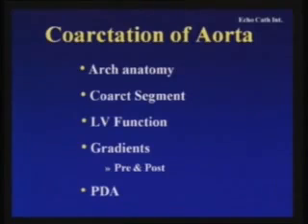In the pediatric age group, it is very easy to define coarctation of aorta by echocardiography. You have to look at the arch in the suprasternal long axis view, the arch vessels. Is the transverse arch hypoplastic or not? We can go for balloon dilatation or not; it depends on the hypoplasia of the transverse arch. Then whether associated PDA is there or not, whether aneurysm is there or not.